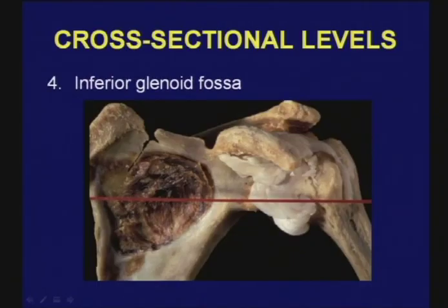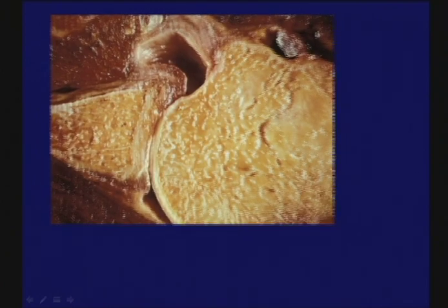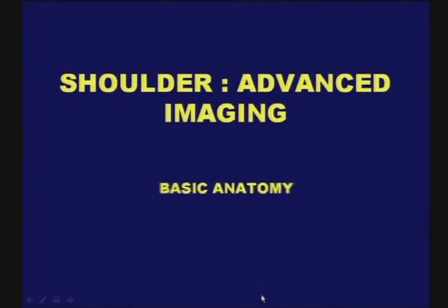And then finally, the lower level, inferior glenoid fossa. This is dominated by a thick capsule, which also contains the anterior band of the inferior glenohumeral ligament. And from our original cadaver, this is what we saw. And it's hard to see the ligament separate here. This is probably posterior band that we're looking at. So that's the background of the general anatomy.